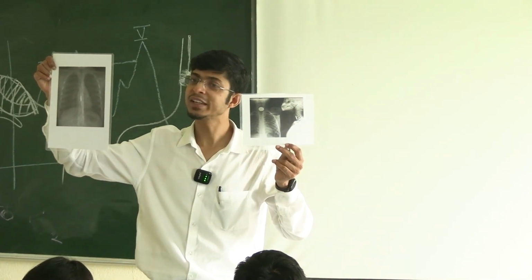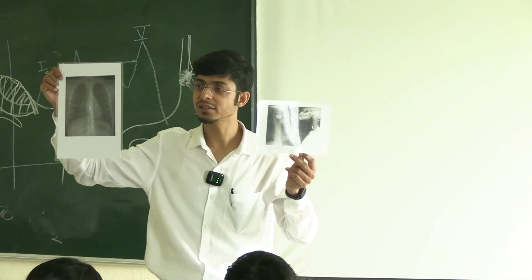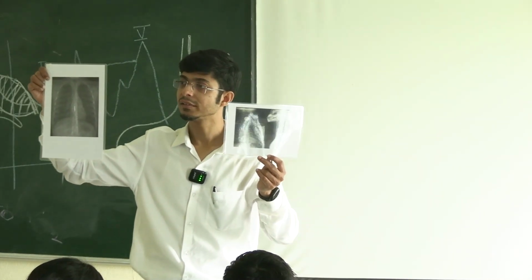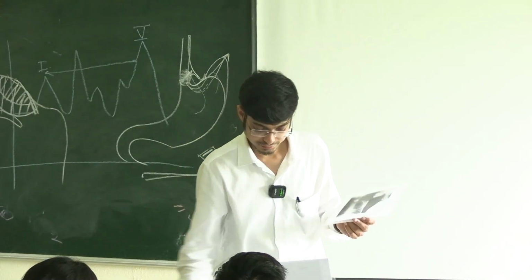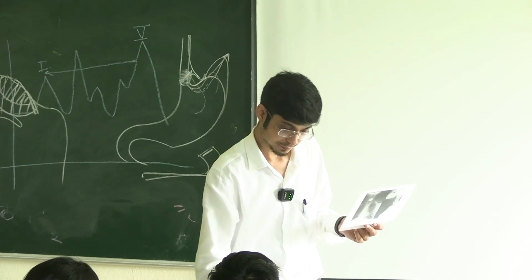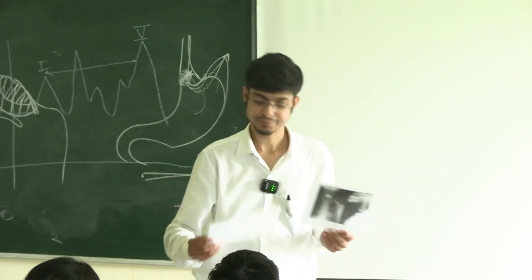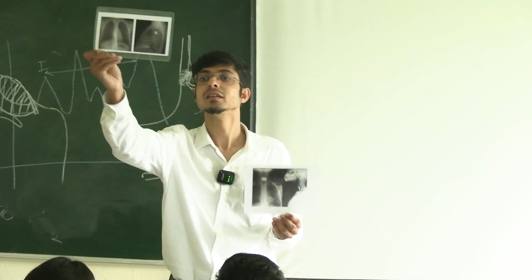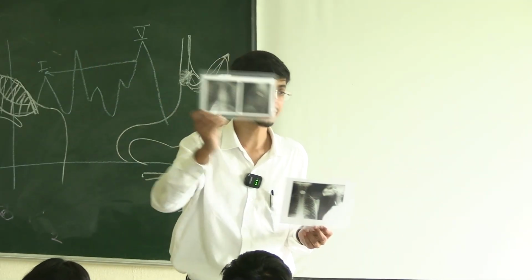Okay? You should never get this extra wrong at least. It is given to alternate students. I will show you. We have one X-ray like that. So this shows both the images, AP and lateral.